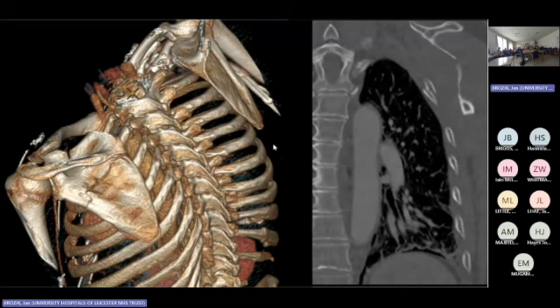With nowadays CT scanners and computers, we can do all those fancy things, and the clinicians are always impressed. And can we get 3D images? And yes, we'll do it, and you can color them different ways, and it's fancy, and everyone is excited, and that's great. So we know the patient has a fractured scapula.